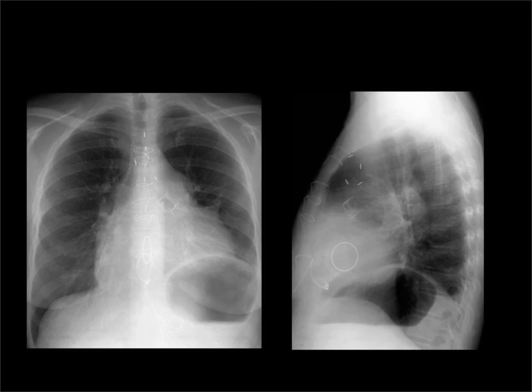And one last example, can you guess which two valves this patient has? It is tricuspid and pulmonary. They don't do the pulmonary very often because you can apparently do quite well without one. Okay, I think that's it. This is much more fun done interactively, but hopefully you've got a reasonable idea about chest x-ray anatomy. Thank you.